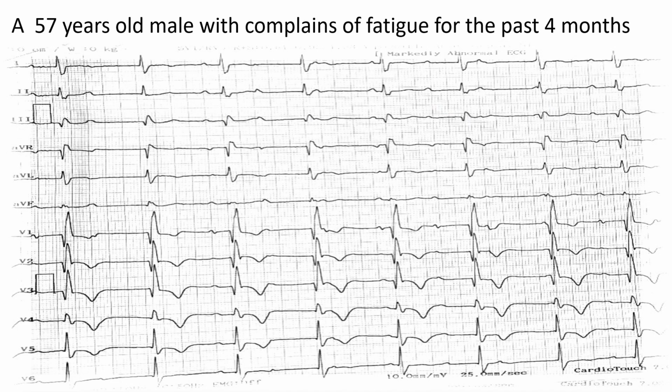Hello colleagues, today we'll be discussing a case of a 57-year-old male who complains of fatigue for the past few months. This was the ECG that was done when he presented to us. Now what we can see on the ECG is that there are some findings which are pretty obvious, and we need to identify them to reach the diagnosis.